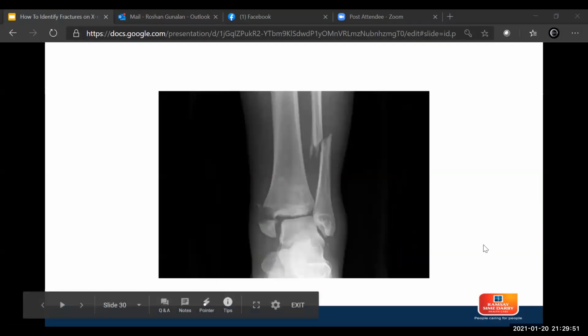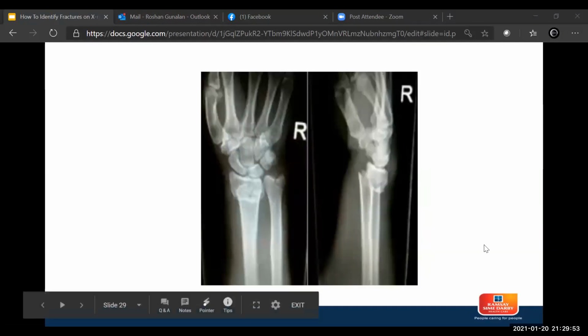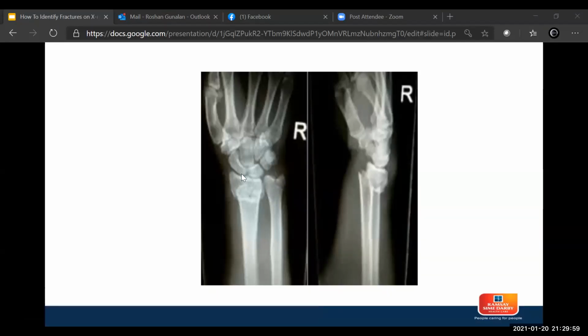Serena asked whether there's shortening of the ulna. No, there's no shortening of the ulna. The ulna is actually there. The radius looks like it's dropped down a little bit. The radial height usually, this part should actually be somewhere up here. It's dropped down, so it's not shortening. Someone asked whether it's volar dislocation of the ulna. No, you describe the distal fragment of the radius, which is fractured and displaced this way, which is dorsally. So it's a dorsal angulation of the radius. Relative to that, the ulna looks like it's volar, obviously.